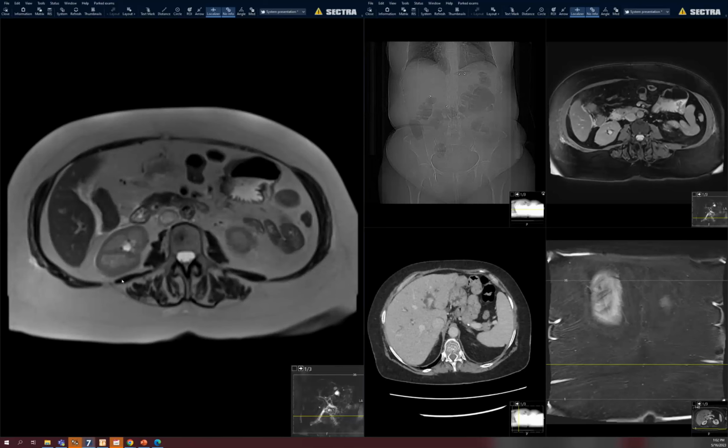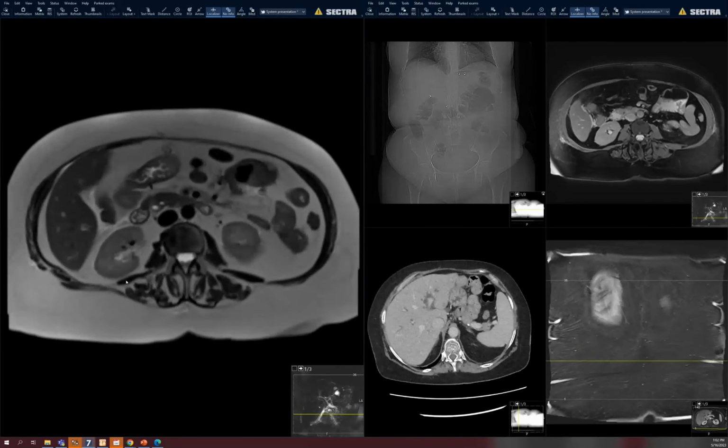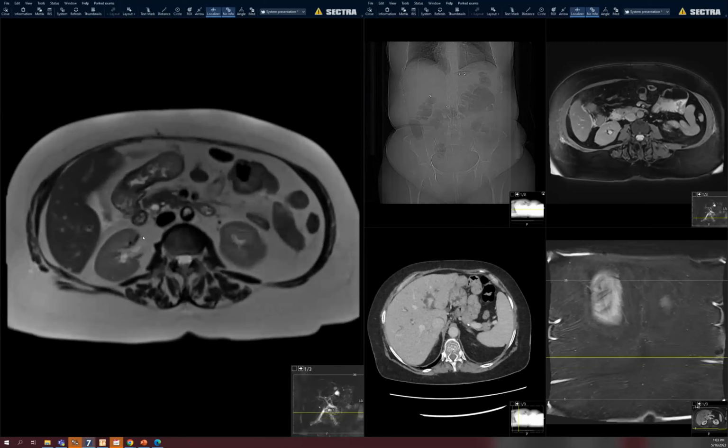And then it looked like there was some, yeah, so it's pretty dilated biliary duct. Looks like maybe a little small filling defect right there. Yeah, right there. Concerning for choledochal lithiasis.